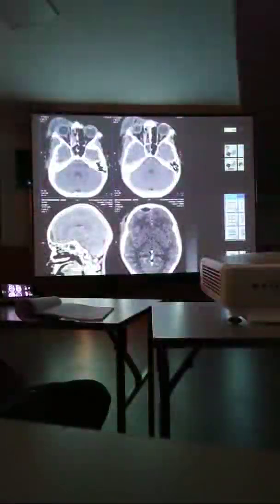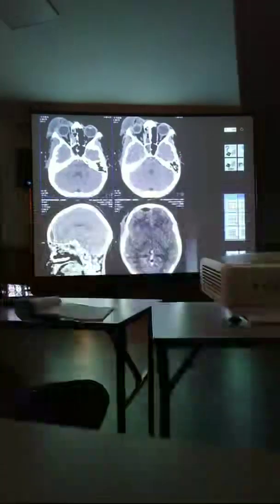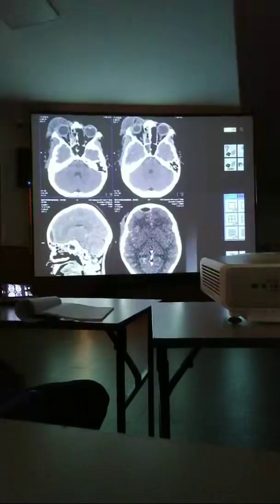This young boy presenting with abscess in the preseptal compartment of the orbit, severe headache, neck stiffness, and you can appreciate the typical appearance of sinusitis in the sphenoethmoidal sinuses. Orbit, a large preseptal abscess is there. Brain, we can appreciate the epidural empyema, the classical biconvex appearance and focal cerebritis. It may cross the midline.